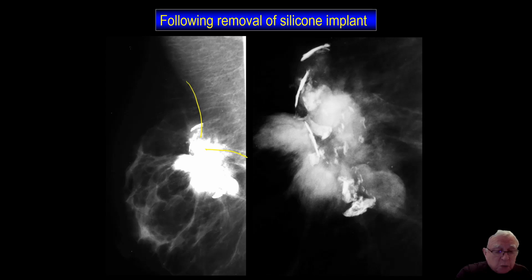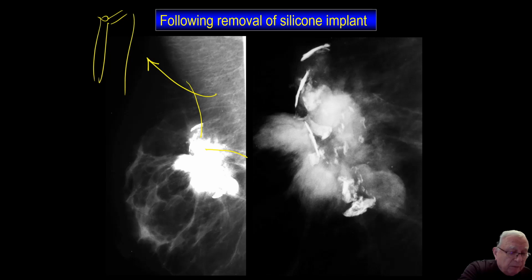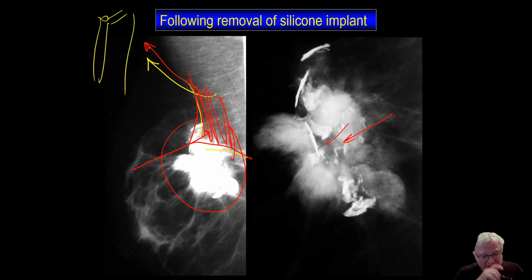She wants to take down one book from the bookshelf, lifts up the arm, and there is a terrible pain. Yes, because this is traumatic fat necrosis, partially calcified, partially oil cyst, which grabs the pectoralis major muscle. So then she wants to use the pectoralis major muscle, and the scar says, nope. And the pain is obvious.